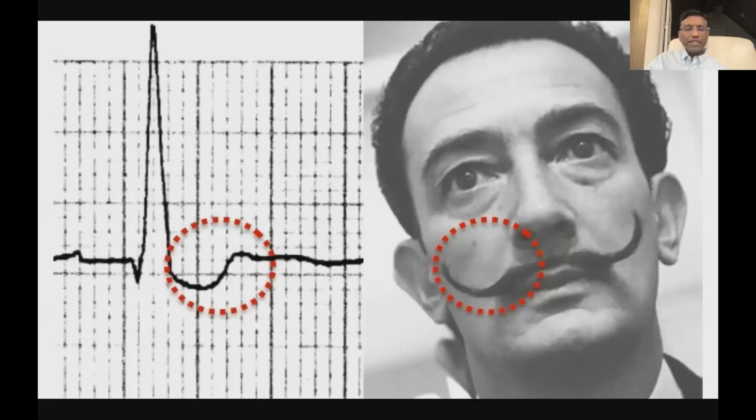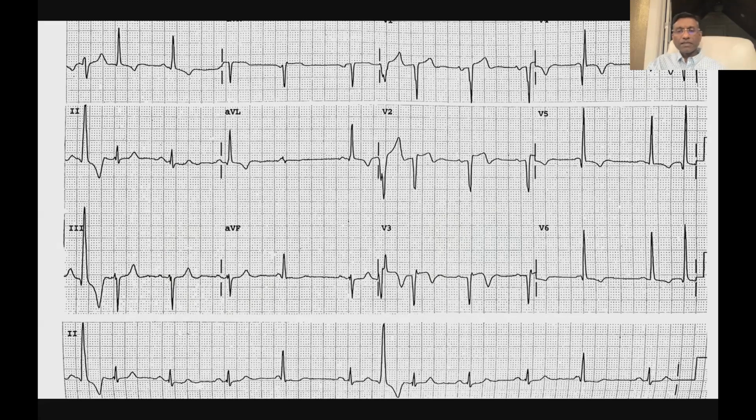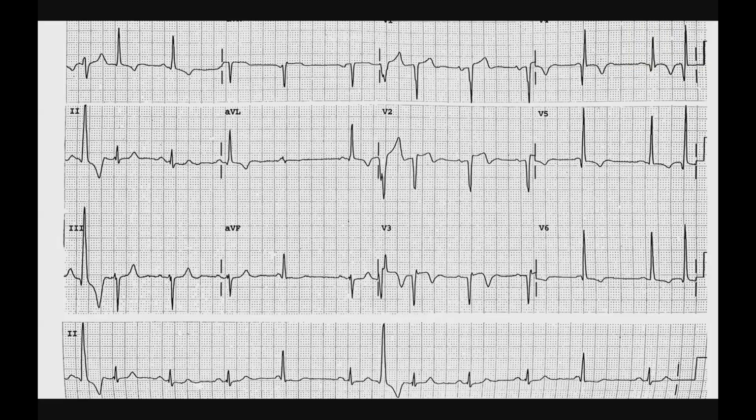Okay, let's switch gears and take a look at a different tracing here. Volunteer, please. Vityara, would you like to comment on this?